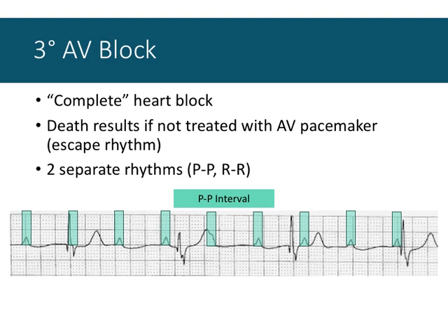which in contrast to ventricular depolarization, as shown here, is not synced, it's not lined up. There's complete dissociation of the rhythm of the ventricles and the atria firing. And that dissociation is because of the AV pacemaker that initiates the QRS complexes. So we have this much slower but still regular ventricular depolarization highlighted in blue.